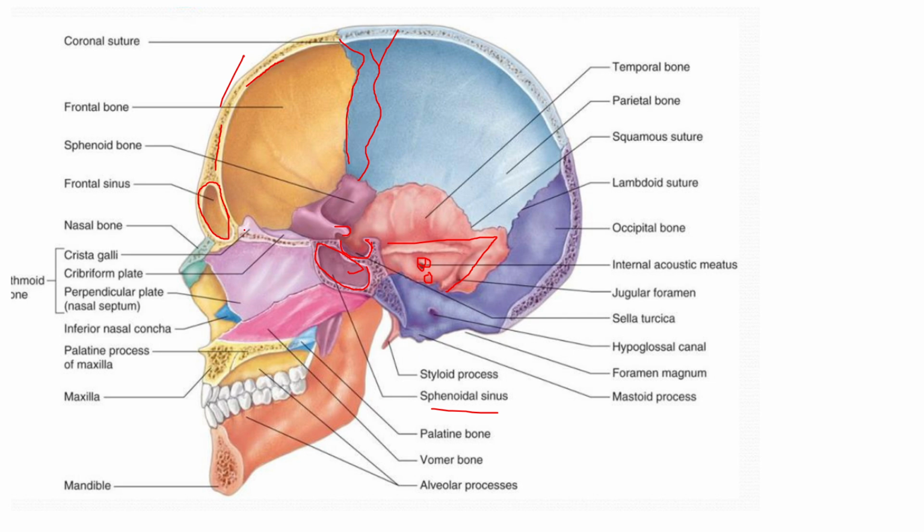Now you can see this is the crista galli, this is the orbital plate of frontal bone, and here you will see two because the other side will also be overlapping. And here you can see the internal occipital protuberance. It is not seen that well here, but in X-ray you can see all these things.